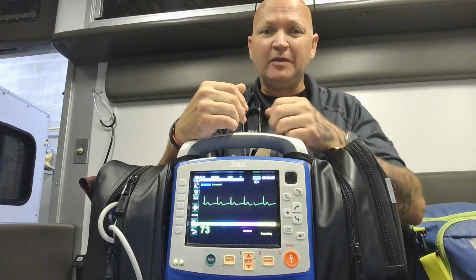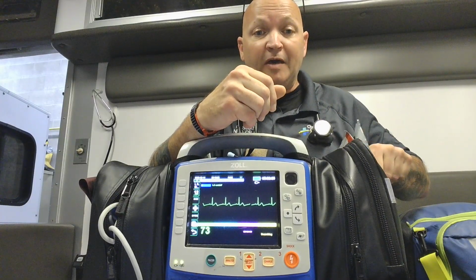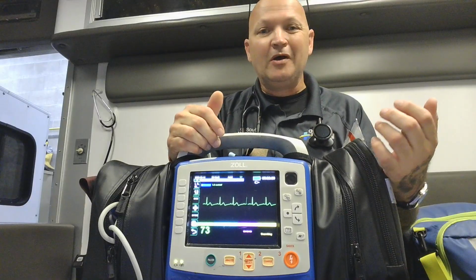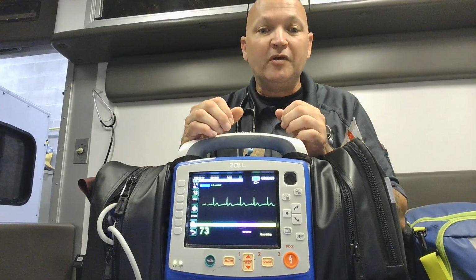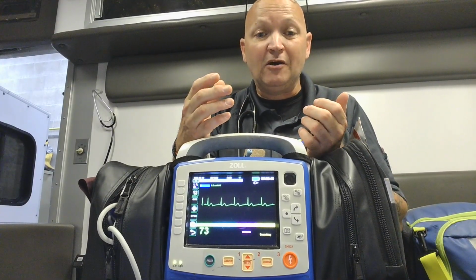Oftentimes you've probably seen on TV shows, or maybe you've even been to the emergency department with family or friends, or been a patient yourself, and you had to have an EKG done. And you're going, what do all those squiggly lines mean? Well, I'm going to go over a few of them and hopefully give you a little more information about what an EKG is and why we use it so much in the ER.